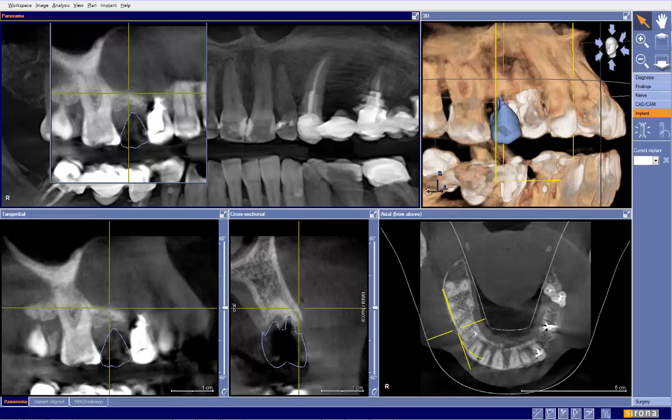Okay, we have been submitted a plan today for evaluation of site number 4 in what is a very common situation that needs implants. This particular case was planned with two different plans. Both were pretty good. So I decided to make a little change from my routine this time. Instead of critiquing the plan that was there, what I want to do is start from scratch and make my own plan for this site.